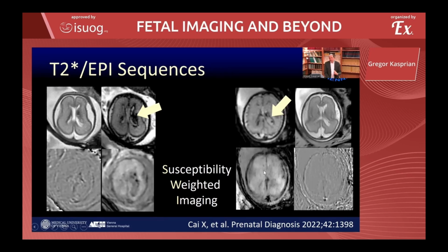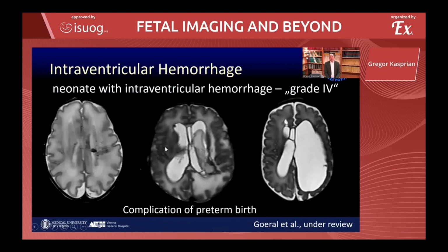With the SWI, we did not detect any blood here, but we definitely detected blood degradation products here. So this was the case which was correct positive, and this was wrong positive. So the SWI gives some more specificity to our findings. The EPI is a very sensitive sequence. SWI is very specific, and I think that's the way we're going to use it in the future.